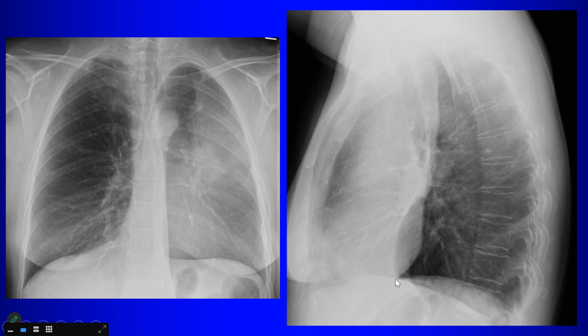How do you interpret that? Is that a normal finding on the lateral view? So what does that represent? It's a major fissure. What side? Left side, meaning there's left upper lobe atelectasis. This is the major fissure on the left side. All this opacity anterior to it is a collapsed left upper lobe. So indeed, this is a luftsichel sign from left upper lobe collapse.